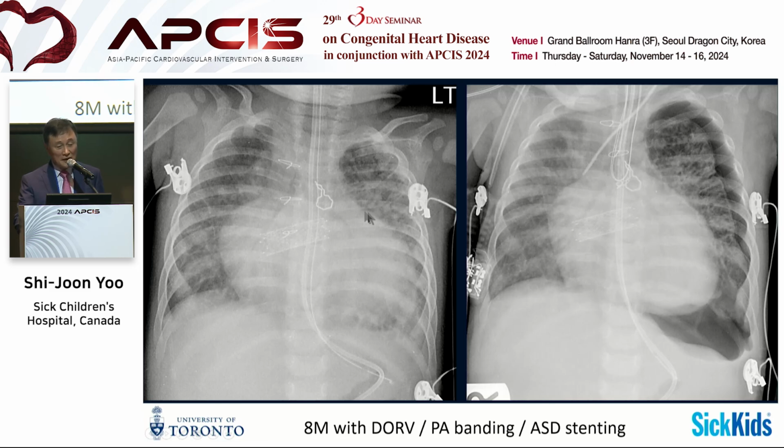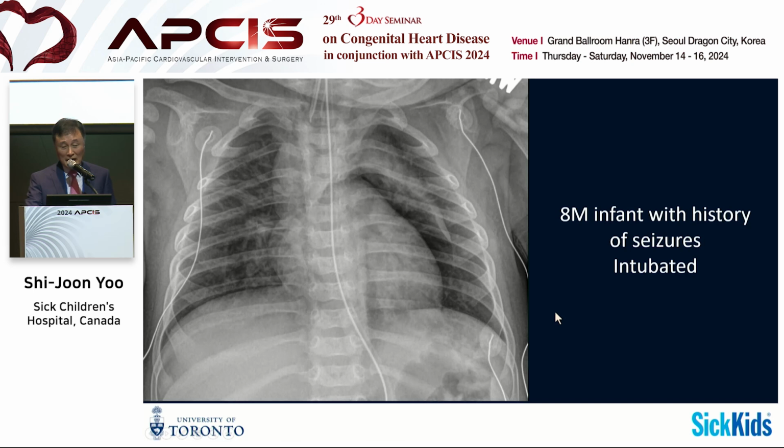Actually, finding of interstitial emphysema was there a few days ago already. So these lucencies are tubular, but not really following the expected caliber change of normal bronchi. So it's tubular, but not tapering out. And then there is a very typical sign of interstitial pulmonary emphysema. And then you might not want to do too much positive pressure on ventilating, because you may have a pneumothorax later on. Okay?